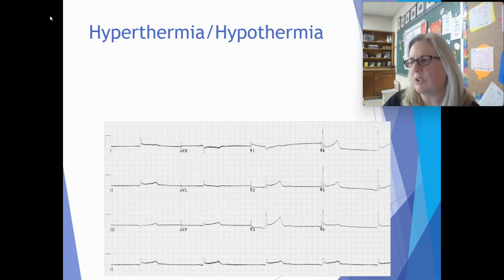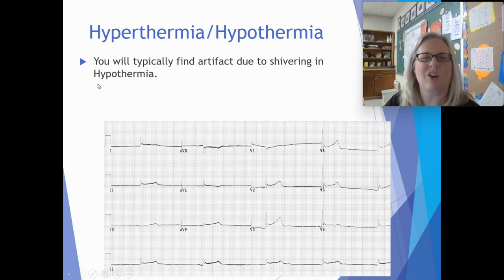All right, so this is interesting too. So hyperthermia and hypothermia, typically it's hard to find this sort of stuff, or hard to read the EKG because they're shivering, right?